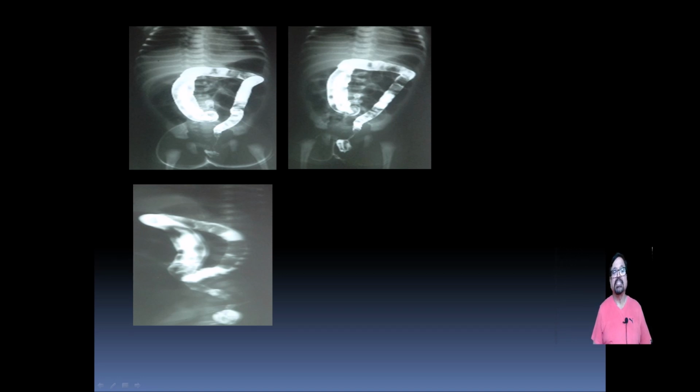Now, this is another indication where either we can use barium or we can use a water-soluble contrast. These are the large bowel studies which indicate that there are certain narrow segments of the rectum, number one. But number two, what is more important is to look at the position of the cecum. The cecum is displaced medially and there are possibilities that it can be a case of malrotation. In that case, again, we have to do barium studies to see the entire small bowel.